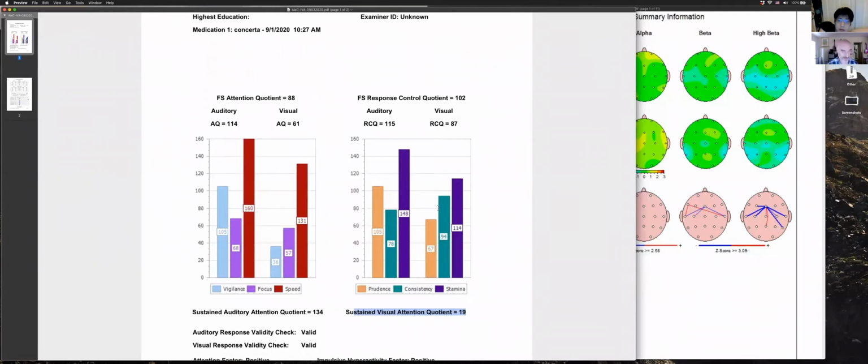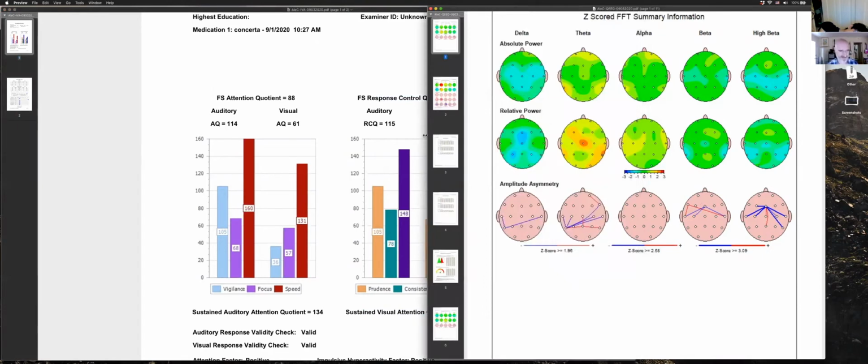And if you're effortful, like this good stamina and speed is you being effortful. If you can be this effortful, you should be able to drag your scores way up above average, not just barely to average. So I can tell there's a lot of resources being pushed up, and there's something getting in the way. So now we're going to look for those things here.